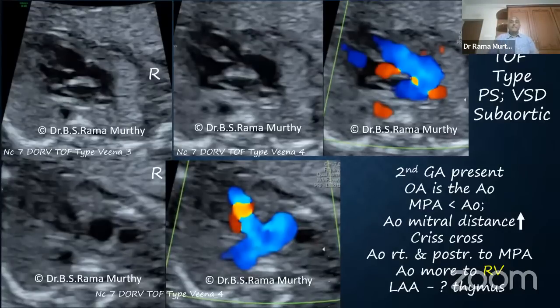Then we went on to CAT type 1, and we saw a case of PAVSD ductus dependent circulation, the case of PAVSD with major aortopulmonary collaterals, and now we come to DORV, which I said is a bag of heterogeneous situations depending upon the kind of VSD, whether it's subaortic, subpulmonic, remote VSD, or a doubly committed VSD, whether there's an aortic stenosis or a pulmonary stenosis, and so on. So it's a mixed bag, and let us see how to crack this case.